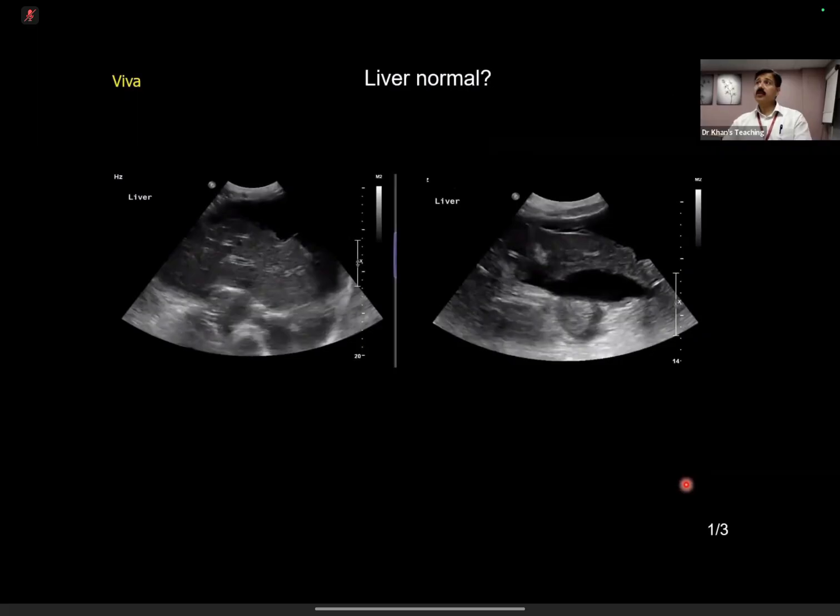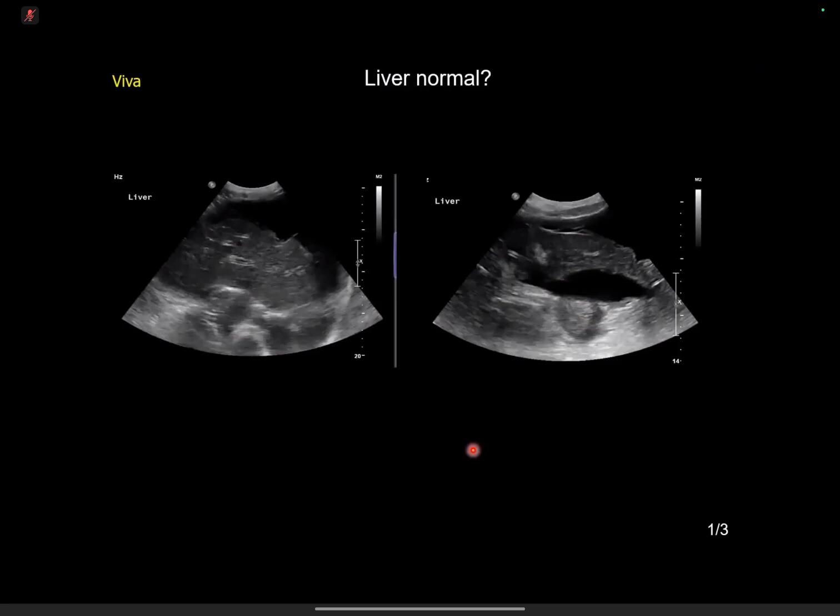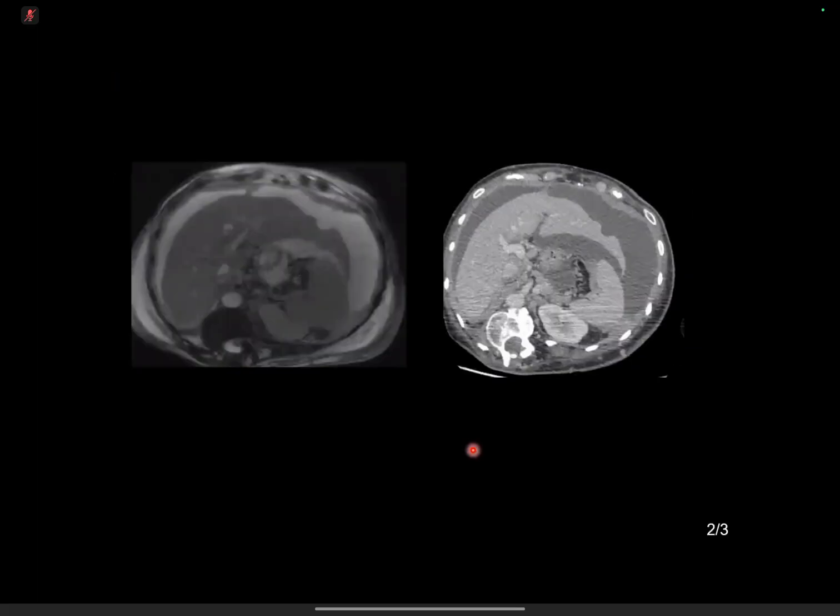Okay, candidate 4. This patient, you are doing an ultrasound scan and you have picked up sort of ascites. What is happening here in the liver? There's scalloping of the liver. Excellent. So what comes to your mind? Will you highlight this in your report, or you will just sort of... Concerned about kind of peritoneal carcinomatosis, also a process that's causing deposits on the liver, that is then causing extrinsic compression and scalloping.